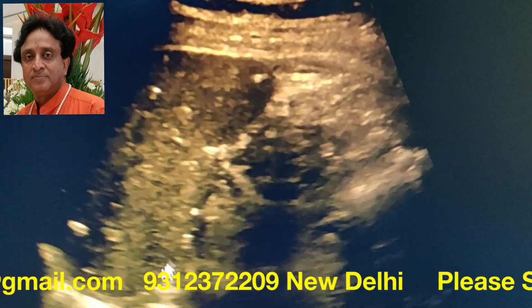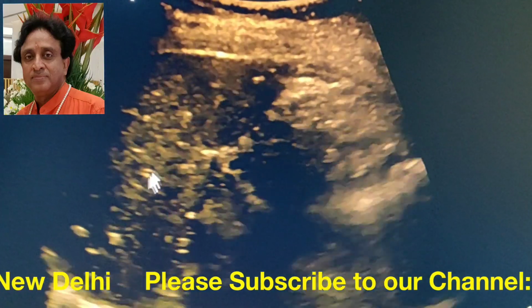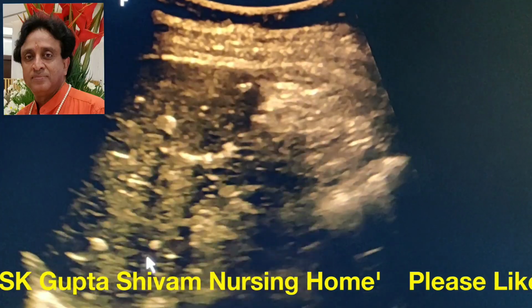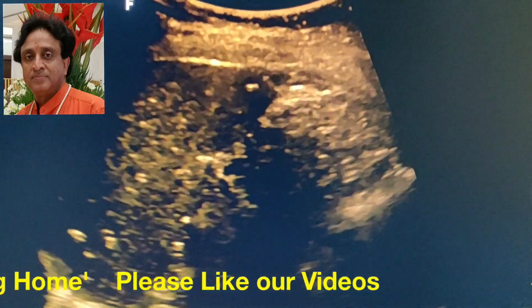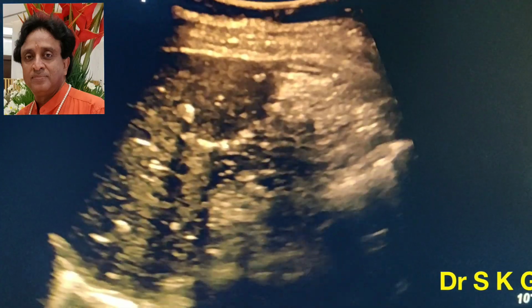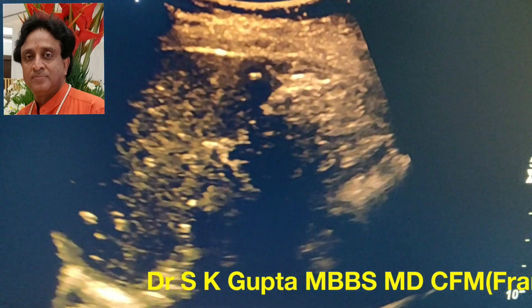Here I have tried to show you the multiple splenic calcifications, small punctate calcification, miliary calcifications, varying from 3 to 5 millimeters in size. Now we are going to present to you a case of splenic calcification where only 1 or 2 spots of calcification were seen in the spleen.